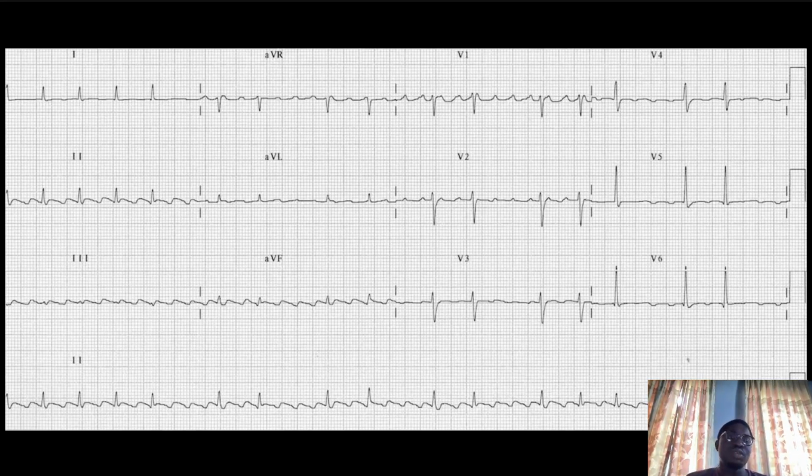I don't know how familiar you might be with ECG as a concept, but if you are familiar with it, you can see what's wrong at first glance, but it helps to always be systematic, you know. The idea is to make a diagnosis based on what you see on screen to help you catch heart conditions or heart problems and to posit management approaches that are beneficial for this particular patient.